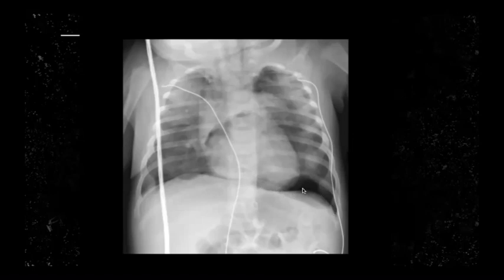by which it is causing delineation of the left hemidiaphragm. Because in this case, perhaps the left pneumothorax is quite small, and when we do the radiograph, we are doing a supine position. So instead of taking the normal appearance of pneumothorax, it just sits anteriorly. So this will be the appearance of a small pneumothorax.